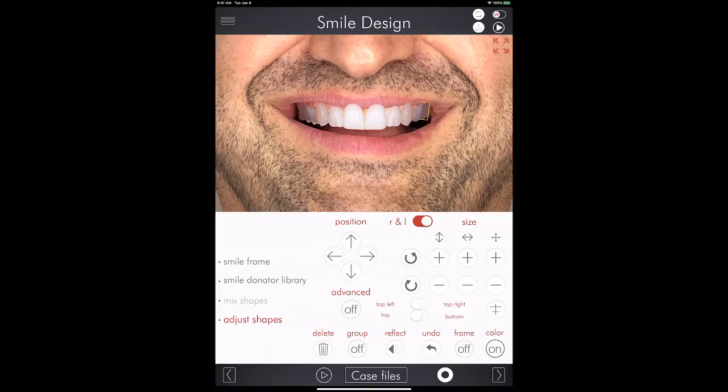Of course, important for you to know, we work on new colors. So we're going to have an update, and we're going to have a completely different set of colors, and everything is going to look much better from the beginning. Of course, you can go to the next screen and adjust the colors, because the colors stem from high quality pictures done in the studio, right?